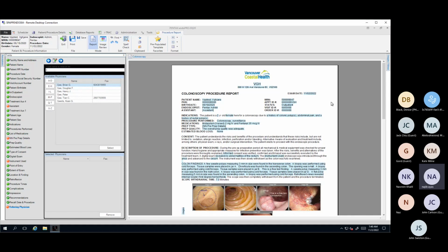And then the other question, maybe you said it before, I might have missed it, but for some of the stuff in the consent, which is standard, I assume that in the report you can erase what you want from the report. Is that correct? So things like consent, you mean? Yeah, let's say, for instance, if you want to add something into the consent, that's just an example. I don't recommend that. Good question, but I don't recommend that. I don't recommend editing the report on the right-hand side.